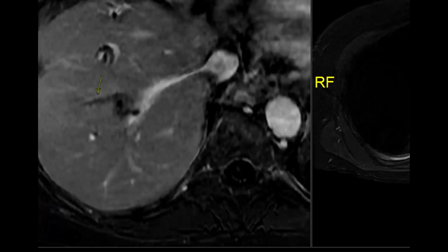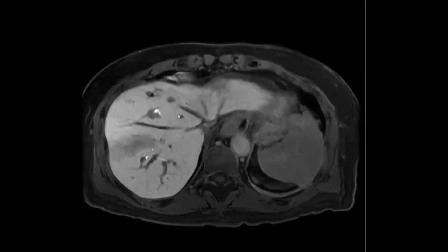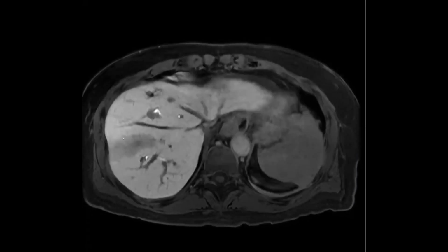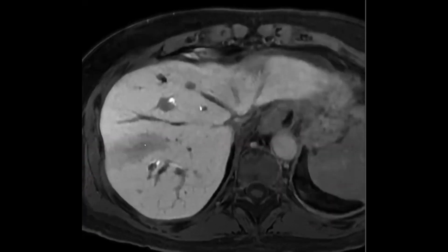That's really neat. So it seems like that tumor is probably obstructing the vein. I've never seen such a focal abnormality around it, though. That's really interesting. So it's T1 hyperintense, so it's probably an early subacute thrombus. And there's surrounding parenchymal edema.